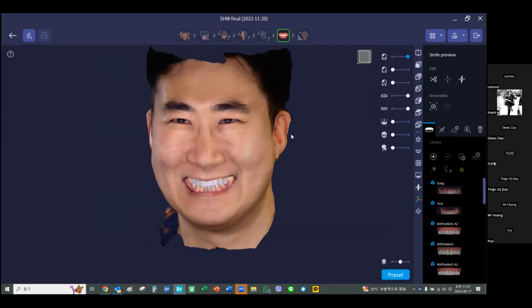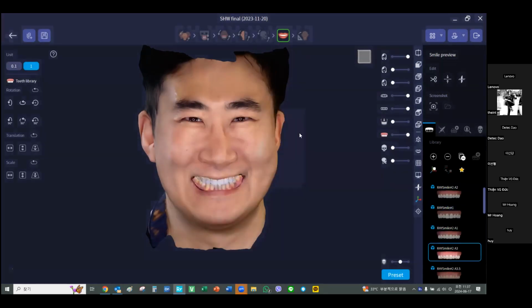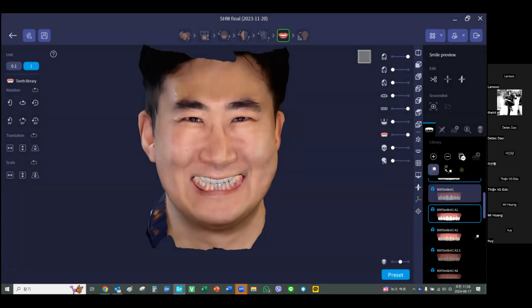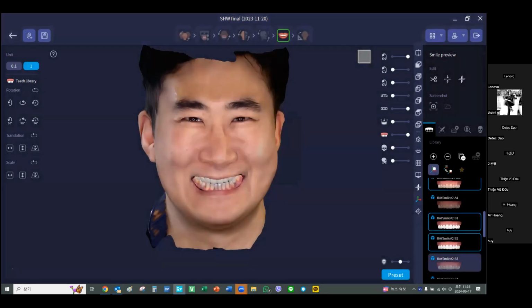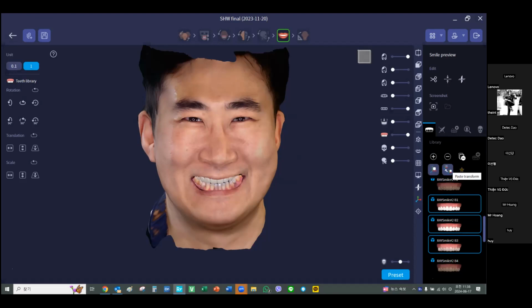Okay. Now it's the same. With the data of the library, with the intraoral scanner, it matches really good. I don't like the color, so I copy. So when the position is okay, copy and select other. But if you want to multi-select, just select and push Control and select. Let's have B2 and B3. So I selected 1, 2, 3, 4, 5, 6 libraries and paste the location.